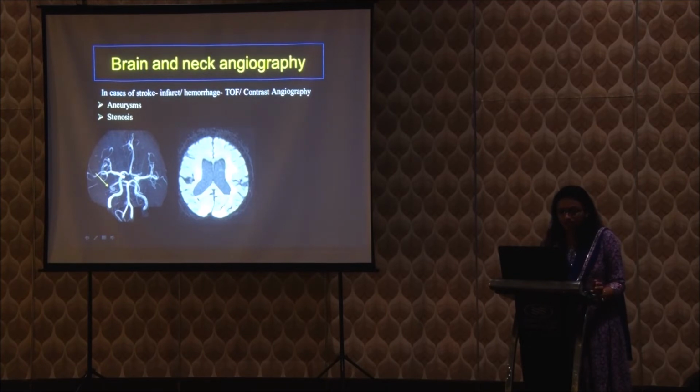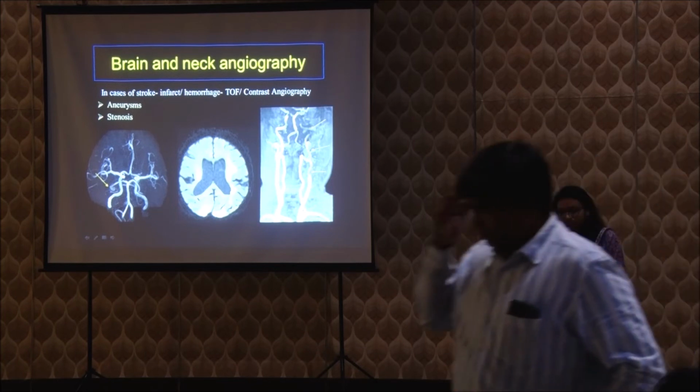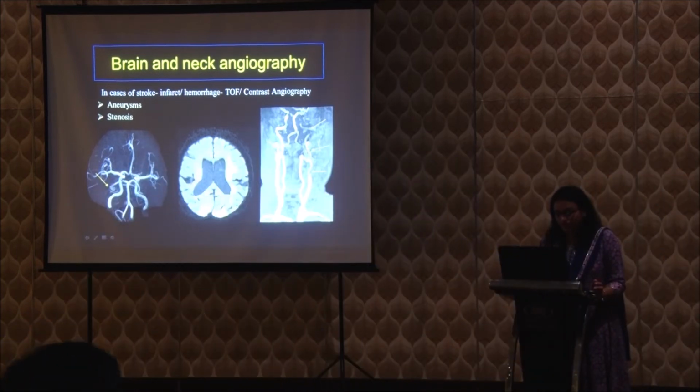So this is a case of left ACA territory infarct, and on neck angiography there was significant stenosis of the left ICA, which was well appreciated on the angiography study.